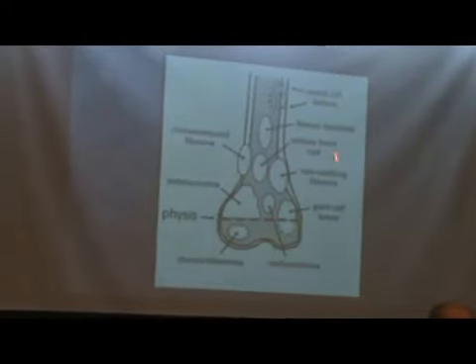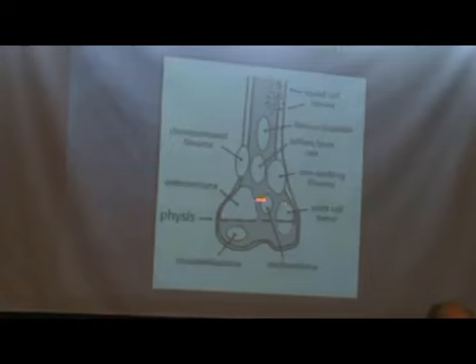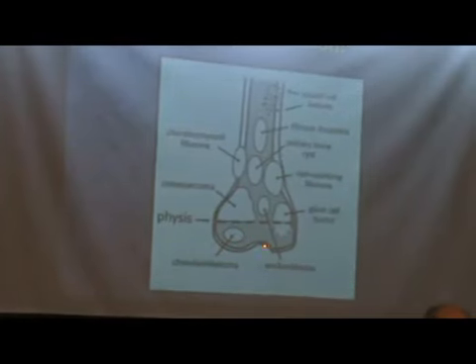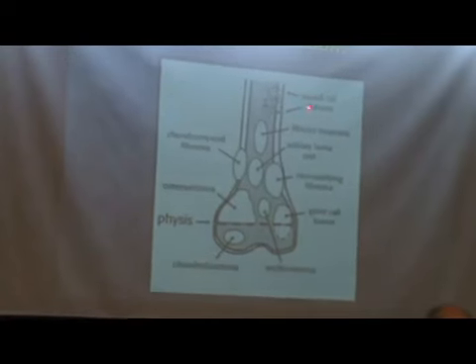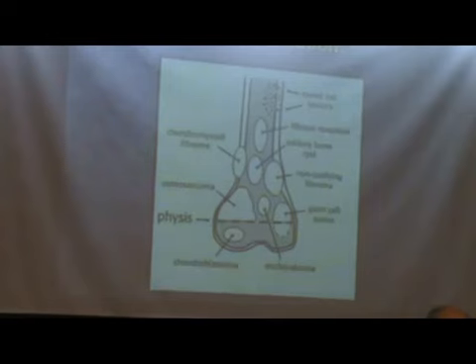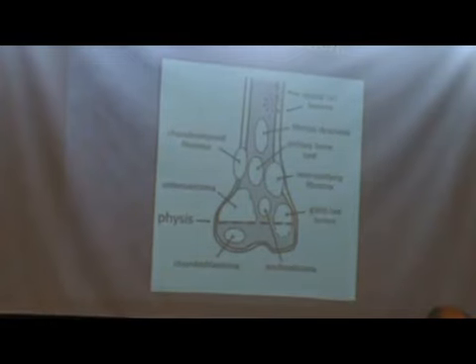The majority of the bone tumors are going to be in the metaphyseal area. When we go into the epiphysis, the differential is going to be shorter, with chondroblastoma and, at a later age, giant cell tumor. Then when we look at the diaphysis, we're going to have the round cell lesions like lymphoma and Ewing sarcoma. And fibrous dysplasia can also be seen in that area.